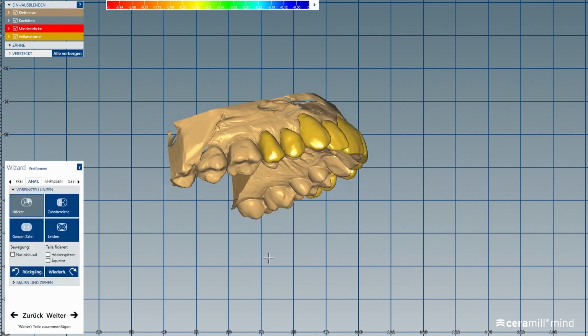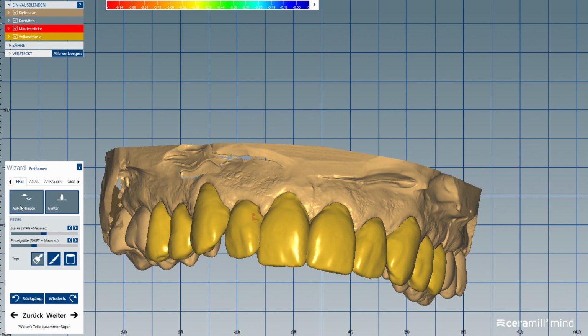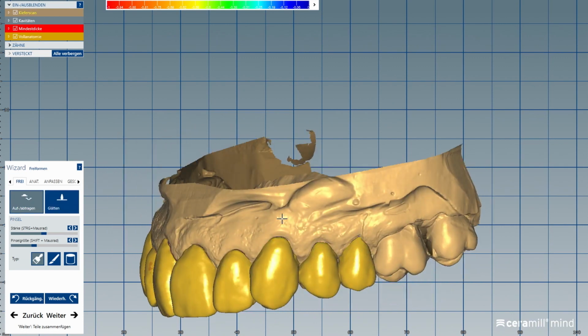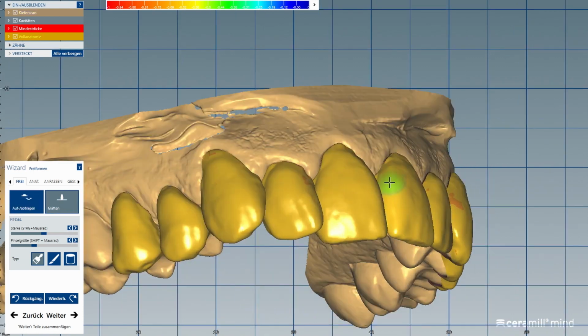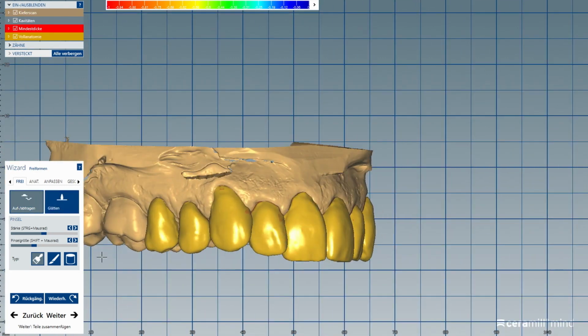After fixing the position, I make anatomical changes if necessary with the available tooth. Adjust approximal and occlusal contacts and move the finished construction to the machine software for positioning in the Edelweiss block.